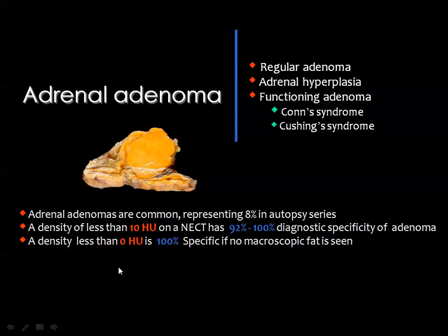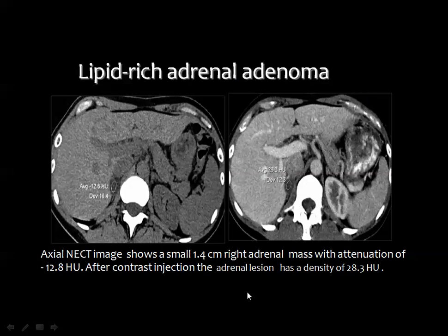And if the density is in the range of -10, below 0 or around 0, this is almost specific for microscopic fat. Then, in order to diagnose the lipid-rich adenoma, which is the well-known form of the adenoma, you have the pre-contrast CT scan, then you inject contrast media, then you have a delayed 10-minute scan after injection of contrast.